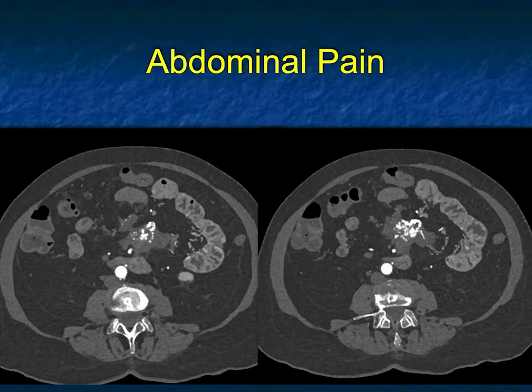And in theory, I would need to think about a patient with lymphoma who's had radiation therapy, potentially radiation and chemotherapy, and the nodes in part calcify. Well, there's nothing else here that makes me think about lymphoma, and that's pretty rare. So really, I'm stuck with carcinoid versus sclerosing mesenteritis.